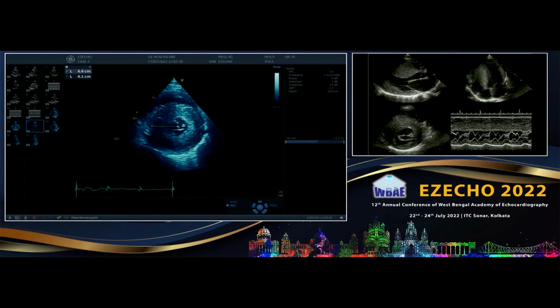So here again measure it, and never take any muscle bundle which is on the RVOT side, correct? So this is your radius, and on that radius, you measure endocardium to epicardium, okay? Any place where you are thinking that this is thick, actually, I'm thinking this is thick, so just put a radius there and then take endocardium to epicardium. Take a midpoint, and just go to the epicardium, anywhere where it is maximum.